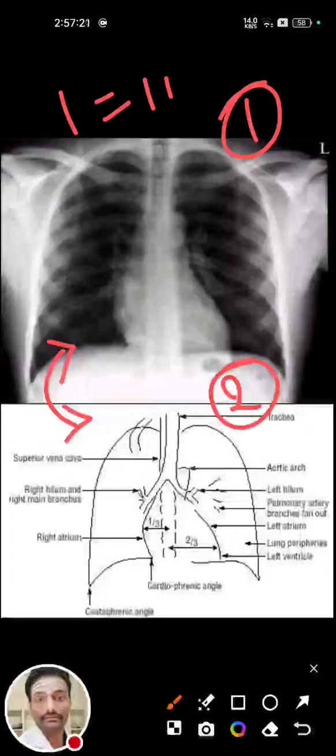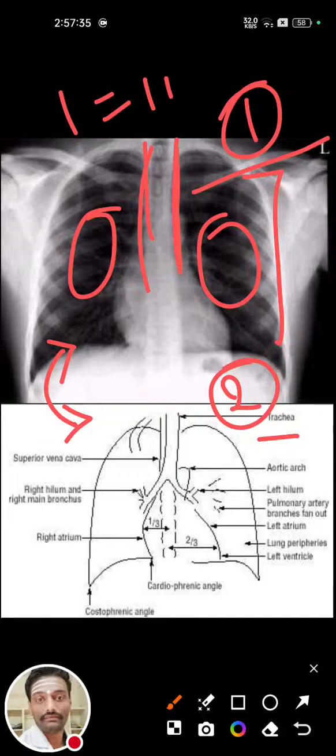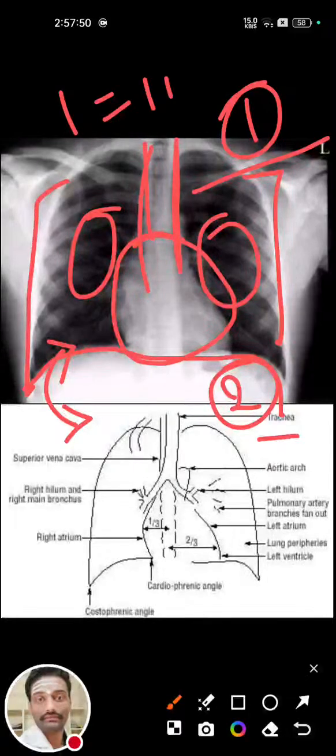If you have any doubt, this is the trachea. This is the tracheal lining. You should look for a clavicle fracture, rib displacement, any consolidation or any bronchial changes. Cardiomegaly. See the changes in the diaphragm, any rib fracture, or the lung alignment.